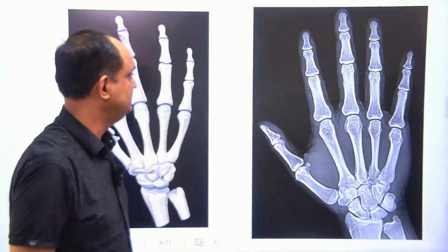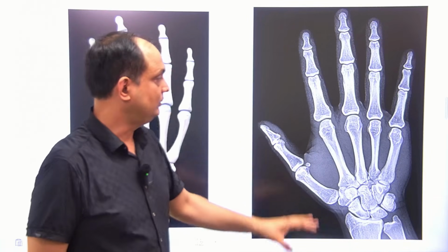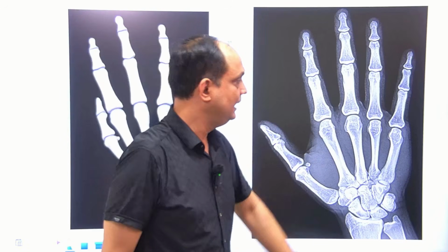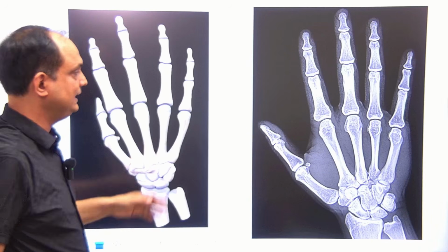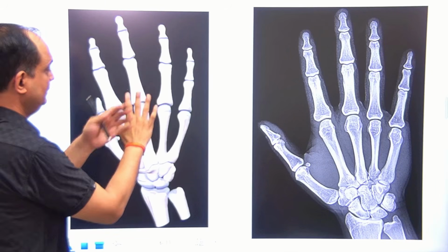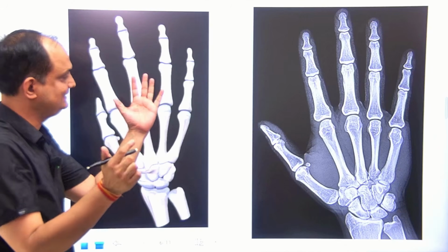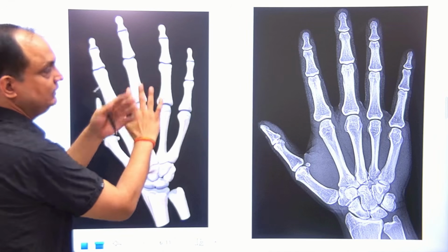Now, next question is, now this is the X-ray of your wrist. Now, apart from the wrist, your bones of palm is also visible. Clear? Now, in this X-ray, if you will see the image, you will find that you are taking the X-ray from back. Clear? So, you are able to see the dorsal surface of the bones. It is not the X-ray from the anterior side, it is the X-ray from the dorsal aspect.